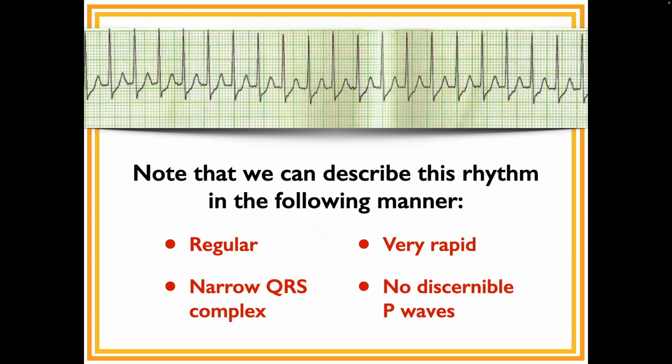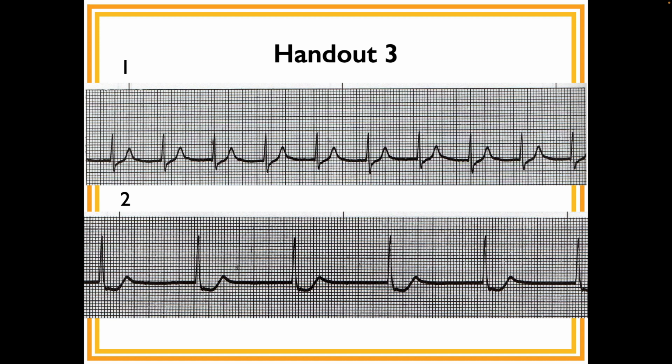Okay, so this one is on page, I think this is page 21 in our handout. Yeah, it says atrial junctional, no SVT. So who's got the pointer? Okay, you're number 1.